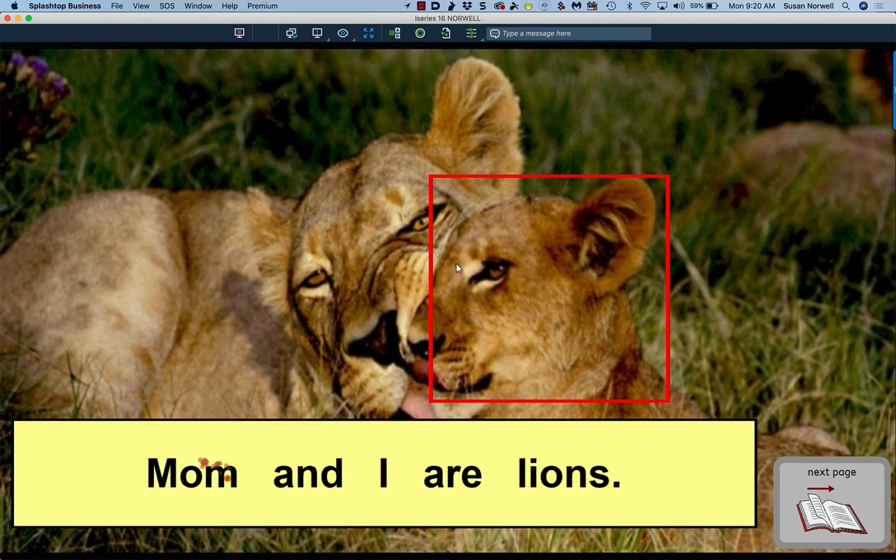It doesn't get you the individual words. And so it's really nice to be able to see where kids are reading. Now, I have found with a lot of my kids, they start in the middle, they go over, and they have to work really hard to get to that left side. And they might stop at midline and then have to regroup and come back to do the rest of the book. But Gaze Viewer is really handy for lots of things.